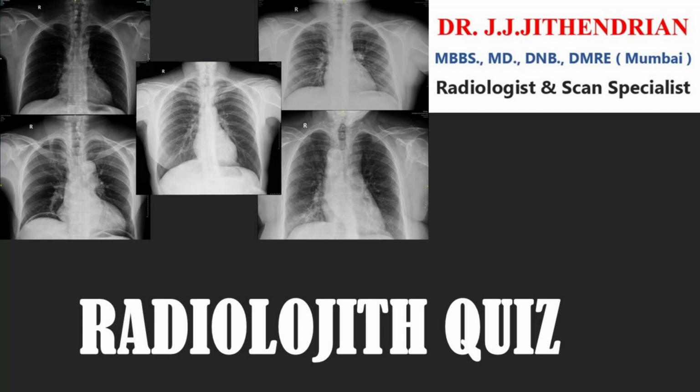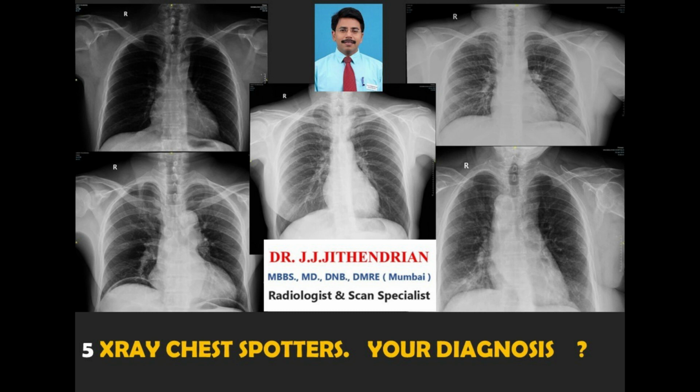Hello everyone. I am going to give 5 X-ray chest spotters. You see the image, then think about your diagnosis. If you cannot think about the diagnosis, at least you can think about the differential diagnosis, right? I'm going to give 5 images now.